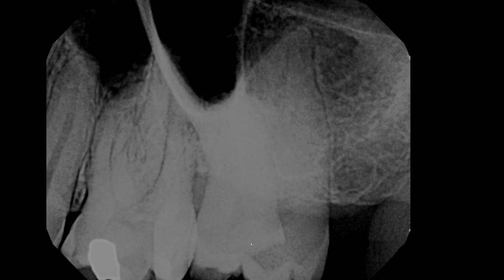Having said that, the point of this video is I want you to note that there is another tooth that may not have been obvious at an initial glance. So that's what I want you to see, and I hope you found this video interesting.